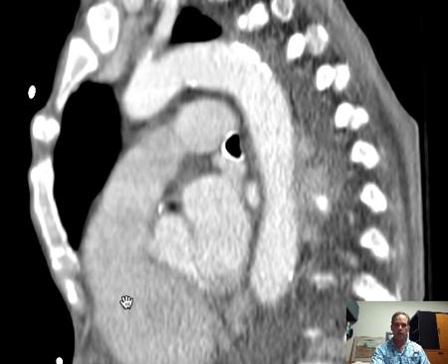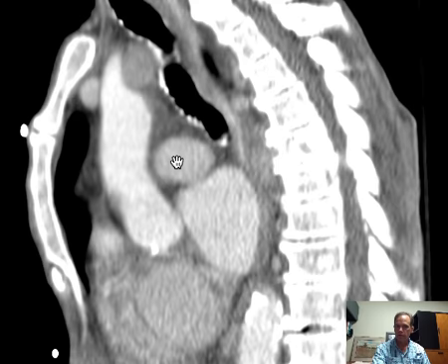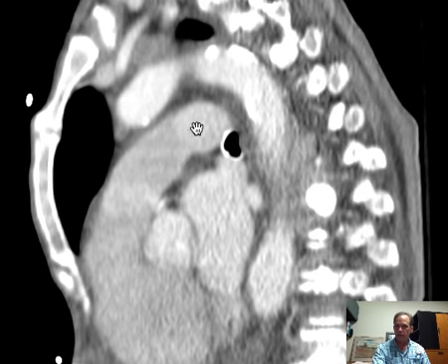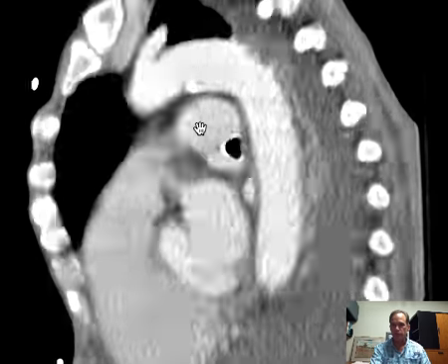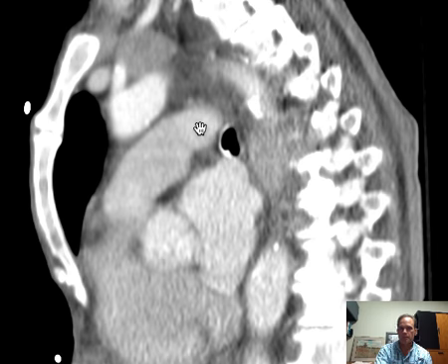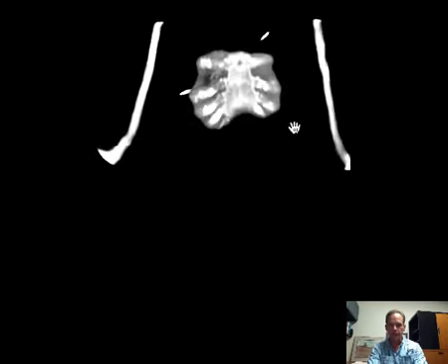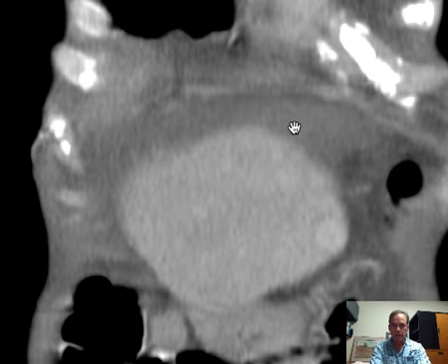The main pulmonary artery arises anteriorly, meaning very close to the sternum, from the right ventricle, and then dives back to branch inferior to the aortic arch, where it gives off the right main pulmonary artery and the left main pulmonary artery, which then, of course, branch into the two lungs. Last chance here, let's try this in a coronal plane, and this should summarize things, I think.